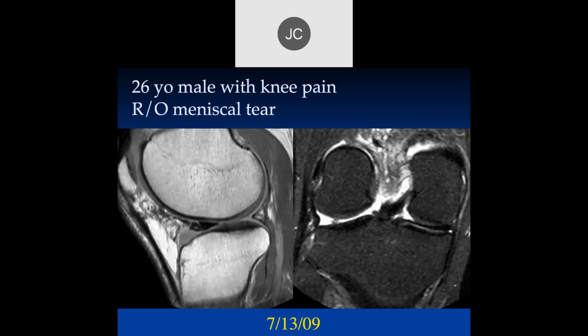Okay, Roberto. We have a 26-year-old. And don't you usually see a depression in the medial condyle on these, John? Or was it the lateral condyle? I forget. It's usually the medial side, and you can, but that's pretty uncommon. But you can. Yeah. That's right.